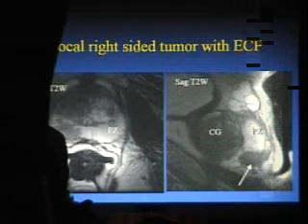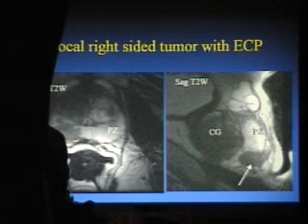You can see clearly extracapsular disease. It's going past the capsule. You can almost see a ghost of a capsule through here. You can see the counterpart over there. They usually are relatively symmetric. If there isn't a lot of BPH, then they should look the same on either side. This does not. It's invading out.